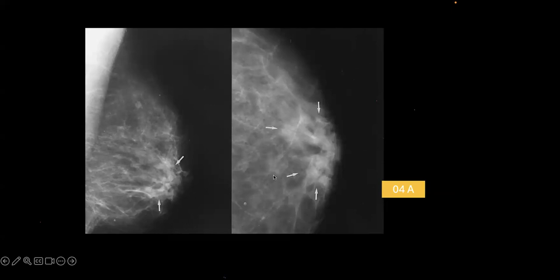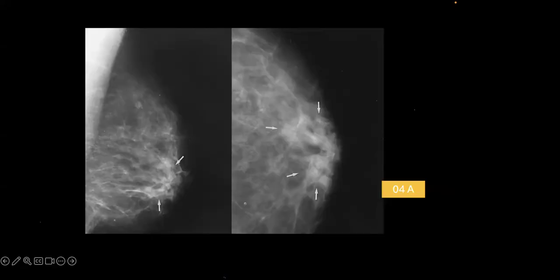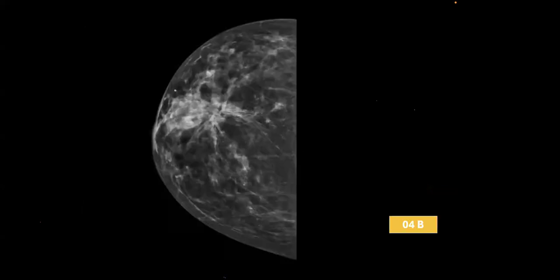So there were two sections in this, like this is 4A. Any guess? It's a benign condition, right? Yeah. So basically it is ductal. There you are correct to some extent. It is ductal ectasia. These are just dilated ducts. And yeah, it can be DCIS also. We'll have to do FNAC in this. We cannot differentiate. And how about this spotter?